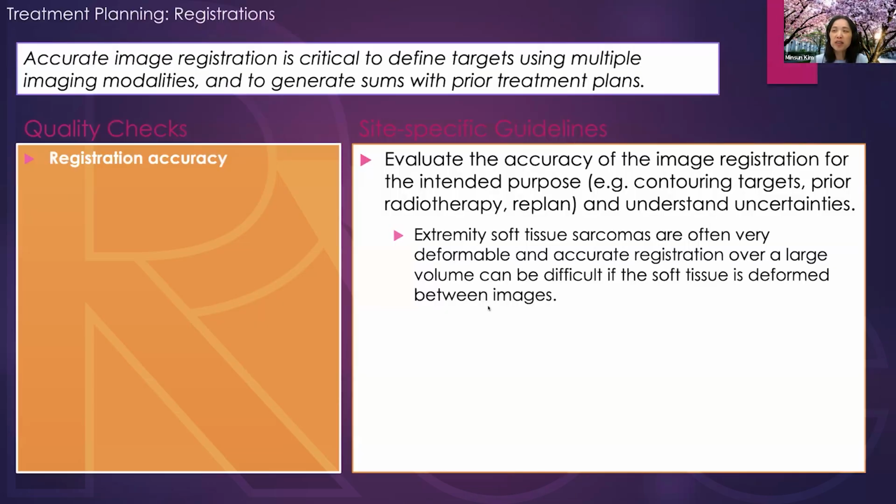Dustin, how important is it to avoid a contralateral leg? So there's kind of two aspects to this question, right? One is how harmful is radiation to the contralateral leg? And how much would the contralateral leg affect the dose distribution to the primary target? The first question is, having beams pass through the contralateral leg is probably okay. There aren't major organs at risk in, say, the muscle of the leg or the bone of the leg that are going to get a significant dose when beams are passing through it as part of treating the other leg.